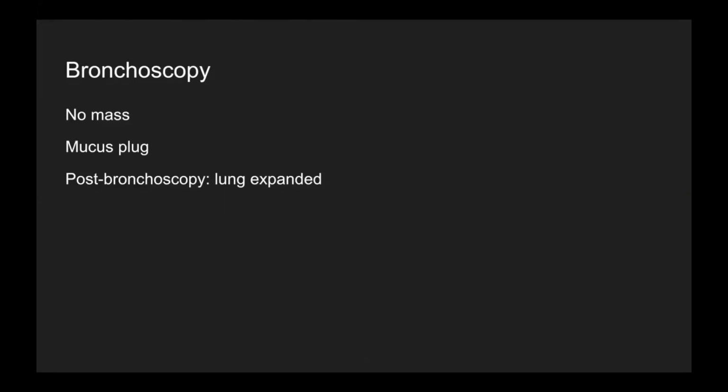If it is a mucus plug, then a simple bronchoscopy might be life-saving, very beneficial for this child. And in this kid, on bronchoscopy, no mass was found, and there was a mucus plug. The mucus plug was cleared, and post bronchoscopy, the lung expanded, not completely, but there was significant expansion. So what we had was a mucus plug.